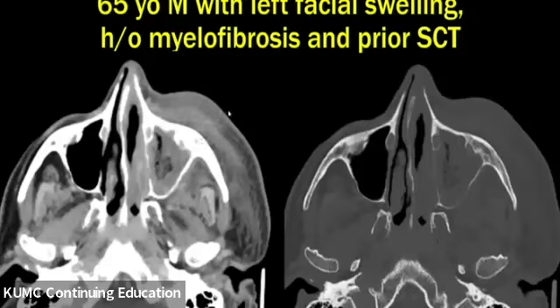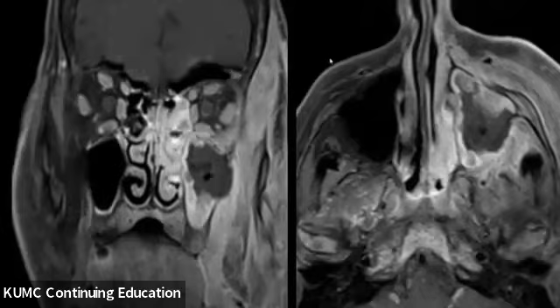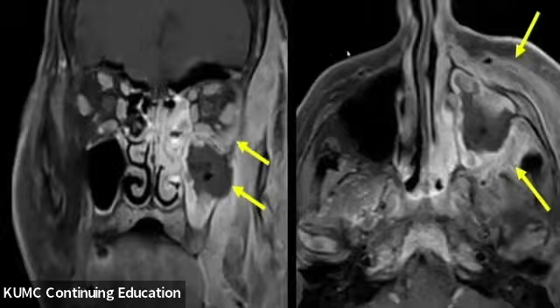Next, we have a patient presenting with left facial swelling. They're immune compromised with a history of myelofibrosis and prior stem cell transplant. So we have axial CT through the maxillary sinus, which is near completely opacified. We see a subtle area of bony thinning and irregularity along that posterior maxillary wall, and then just significant surrounding soft tissue inflammatory change. Follow-up MRI in the same patient, we see an area of non-enhancing mucosa in that affected left maxillary sinus, and then just extensive extrasinus extension of infection, including the premaxillary and retroantral masticator space, as well as the orbit.